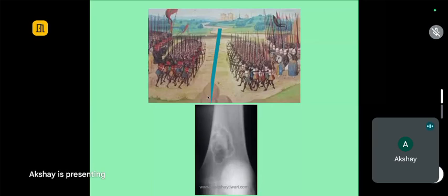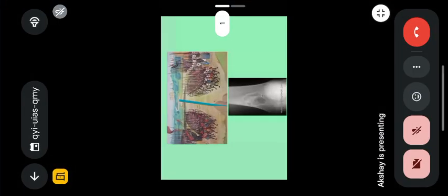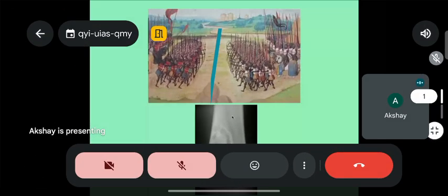See a benign lesion. Generally, a benign lesion is very easy to see, right? Easy to see, and there is a thick sclerotic line which separates the bone from the disease at the zone of transition. So, if you want to know what is a narrow zone of transition.